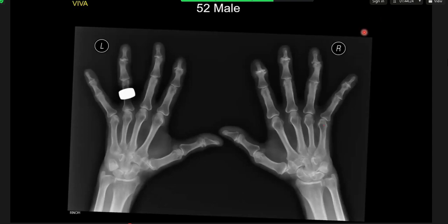And what else can I see? So the rest of the metacarpophalangeal joints are normal to me. And there is a subluxation also noted in the distal interphalangeal joints. Okay, just concentrate on the distal interphalangeal joint, and whatever you see, can you conclude your film on that basis?